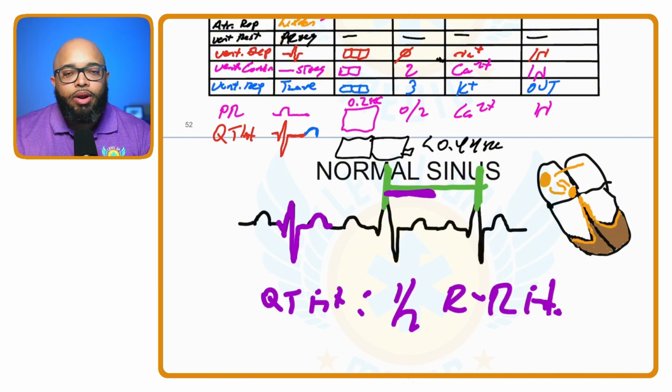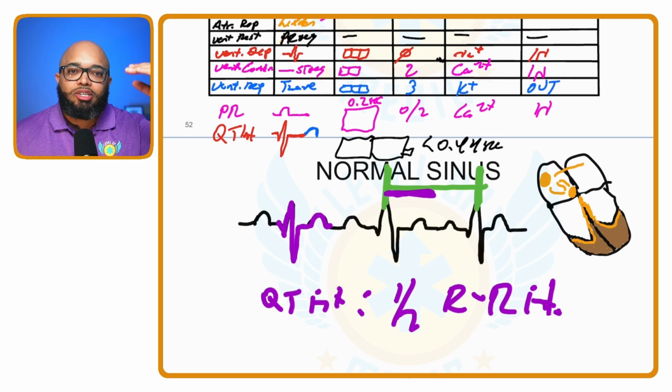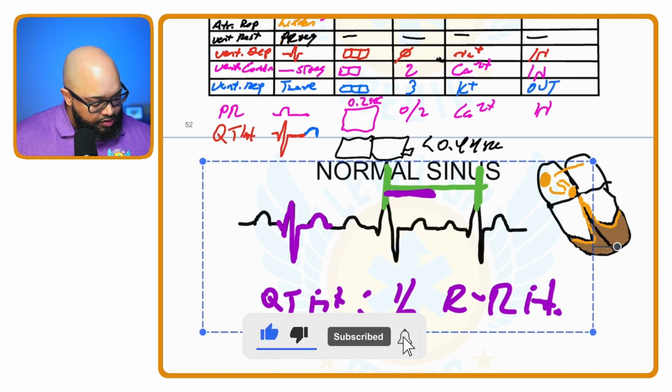So if you have any critical patient, whether they're in an ICU environment, a TICU, a TBICU, a NICU, any of the ICU, if they're in critical care ground transport, whether it's on an ambulance, helicopter, fixed wing, it doesn't matter. Any critical patient in the ED, wherever they are, you need to pay attention to all of these things as you're looking at the EKG. It's not enough just to say, oh, it's sinus tach or sinus Brady. No, we need to systematically interpret every EKG, okay? Let's go. Now, let me clear some of this off the screen just so it's not so crowded.